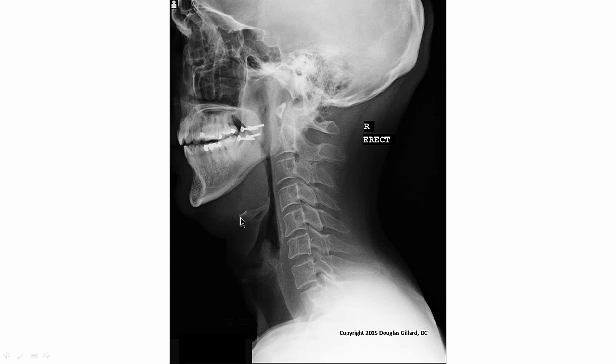What's this thing out here? That little movable bone, that's the hyoid bone. Okay, now we've got some air shadows you'll learn next in Gross 2. We'll talk about these pharyngeal regions. This is the oropharynx right down to here. Comes down to the epiglottis here. There's the trachea, right? Esophagus would be back in here. We'll learn all these. Maxillary air sinuses, you don't need to know that one right now though.